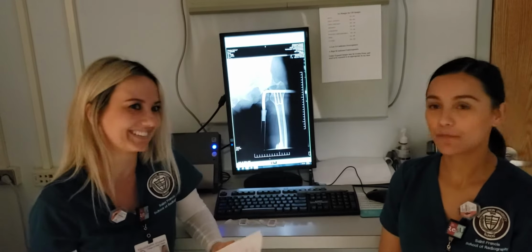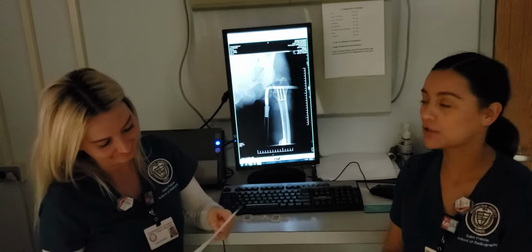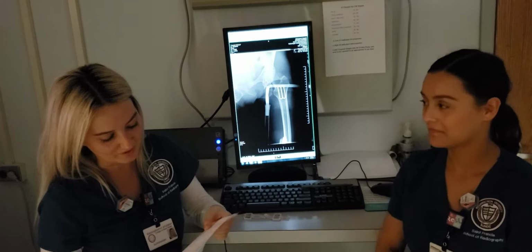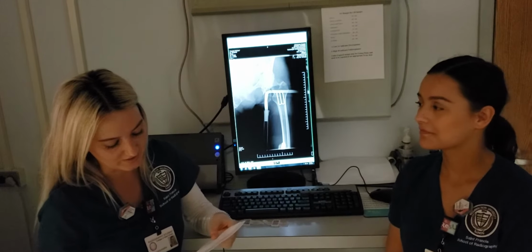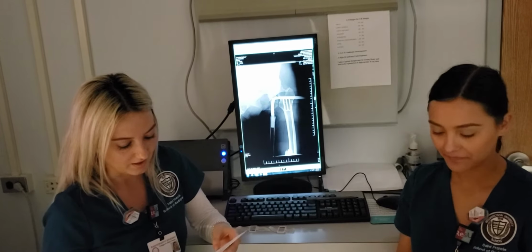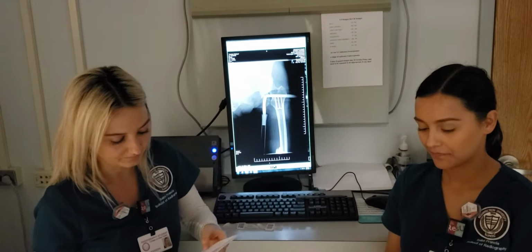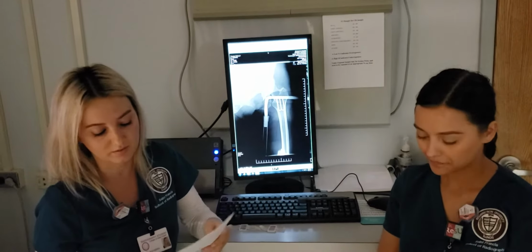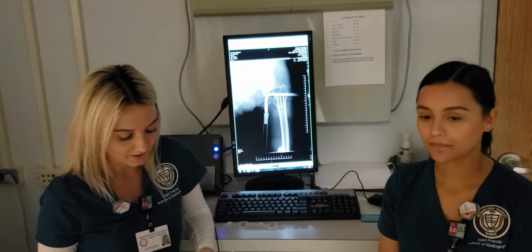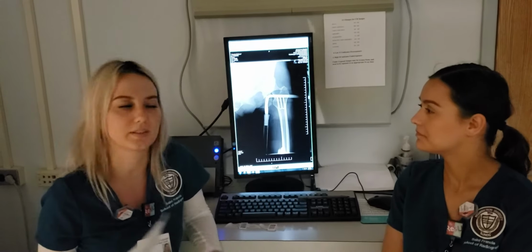So today we're going to be doing an image presentation for femur. This is the St. Mary's group, femur trauma. Okay, our patient is a 66-year-old female. Her history is that she missed a step near the bottom of the stairs and she fell. She also has a history of osteoporosis. The reason for the exam is that she fell, and she has pain in the left femur. The procedure requested was femur, 2 views of the proximal and distal femur.